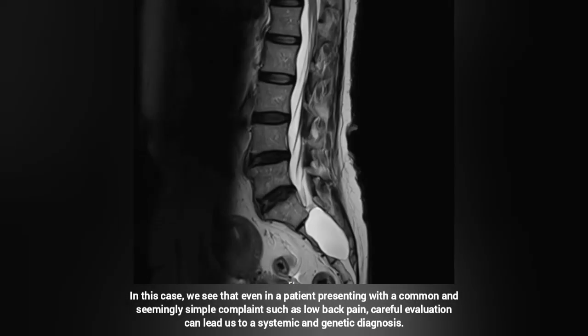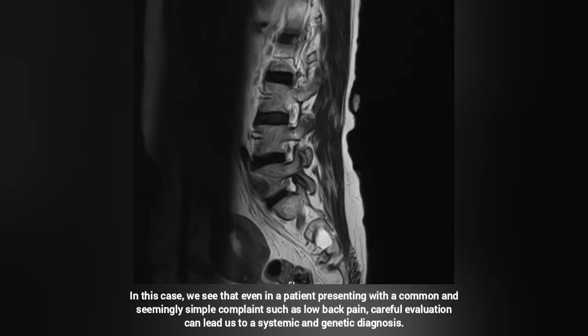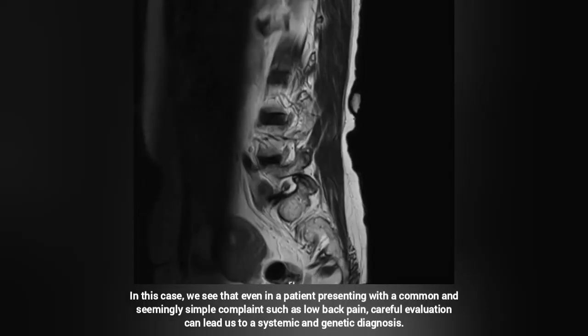The sacral lesion demonstrates signal intensity similar to cerebrospinal fluid. This finding supports the lesion containing fluid. Posterior vertebral scalloping is again clearly visible.